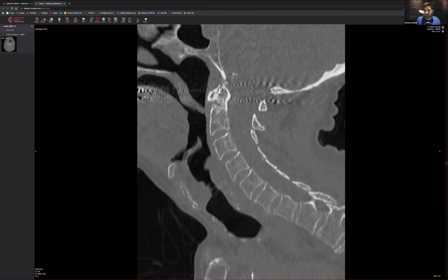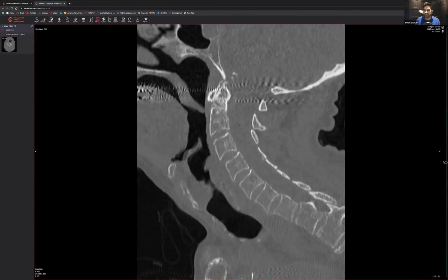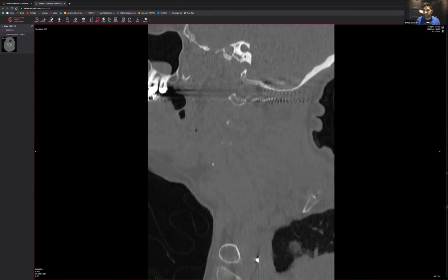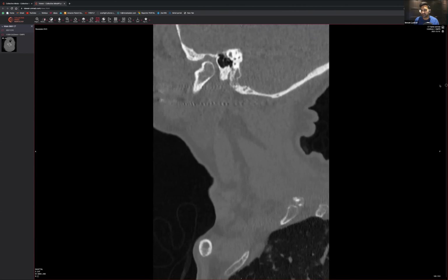But even despite that, we can definitely see what looks like a fracture there. Can you see that? It just doesn't look like a brand new fracture. It looks a little bit corticated on the edges, but clearly abnormal. In that situation, you've got to make sure there are no other fractures anywhere else, and everything else looks okay. The distance between C1 and C2 is actually preserved, so we're not worried about a ligamentous injury in that area either. So this looks like a straight up C2 fracture, probably a little bit more chronic than one would normally anticipate these fractures coming in.